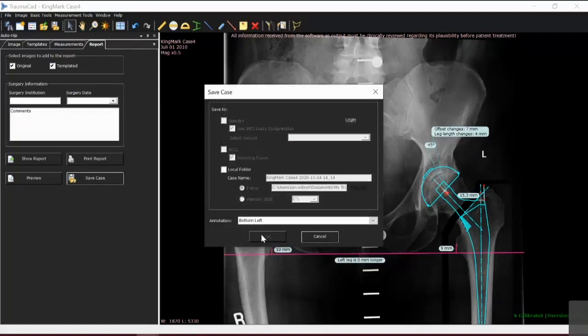It's important to point out that we've copied the original DICOM image, and we're sending the copy back to the PACS system. So we never affect the original image. When you're in the operating room now, both the patient's image pre-planned and planned can be brought up on the screen.